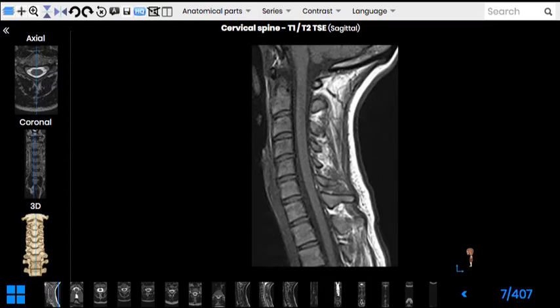The bodies of our vertebra are all located anteriorly here, and the bony processes which are just behind are the spinous processes, of course. We have some space between them, between the arches and bodies. This is the vertebral canal. The spinal cord is running down through it, and we have some dark lines just in front and behind the bodies of the vertebra.